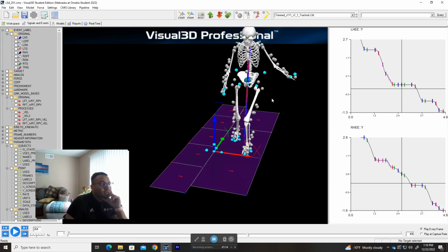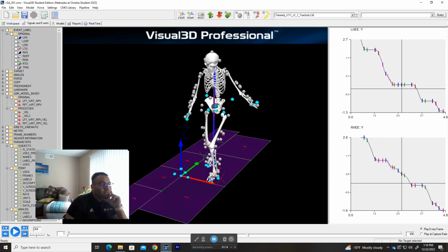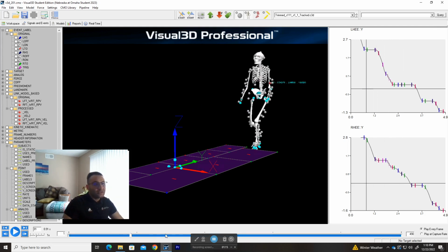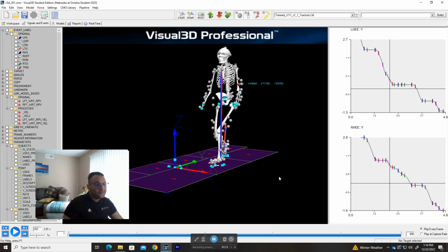But the first thing you notice here is that these specific markers are gray now. They're not red anymore because they're processed, they're filtered, they're not raw anymore. And also, like I told you, I made sure that the pipeline will show us the left and right heel markers and graph them, and then it highlights all of these events.